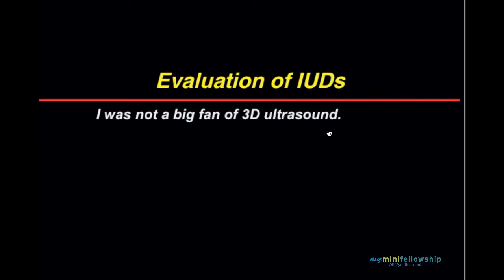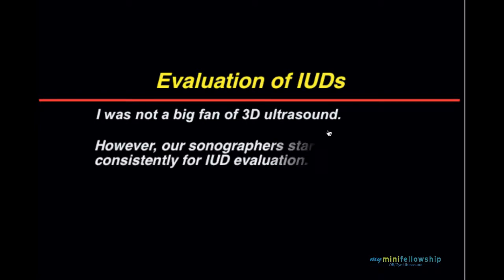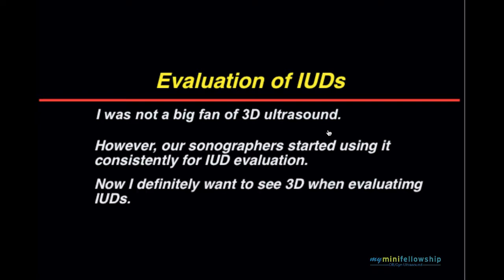I was not a big fan of 3D ultrasound, and I'm still not a very big fan of 3D ultrasound. However, even though I was not asking for these things, our sonographers started using it consistently when they evaluated IUDs. Big deal, I thought. Now I definitely want to see the 3D when I'm evaluating IUDs.